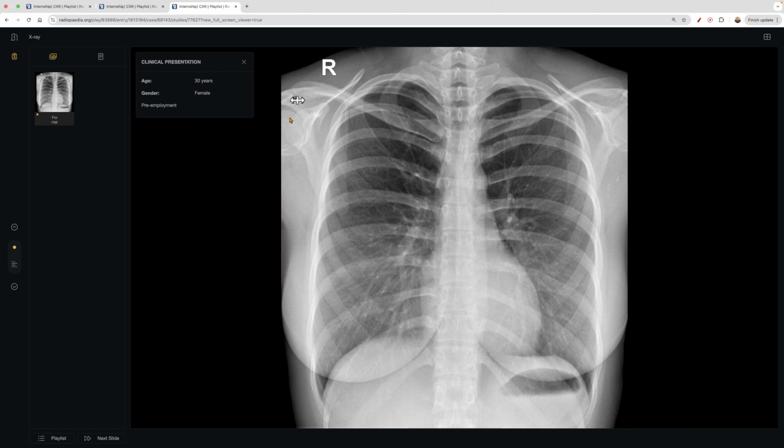So we can see the humeral head here, and then we can see the acromion, and then it meets the clavicle, come across, same structures. You can see the coracoid process here, the superior and inferior angles of the scapula, medial and lateral borders of the scapula as well. You can see the lung here. This is the left lung, and this is the left hilum. This is where the left pulmonary artery and vein enter, as well as the left mainstem bronchus. And these little structures that are flaring out, that's all pulmonary vasculature. Those are not the airways. Those aren't bronchi or bronchioles.